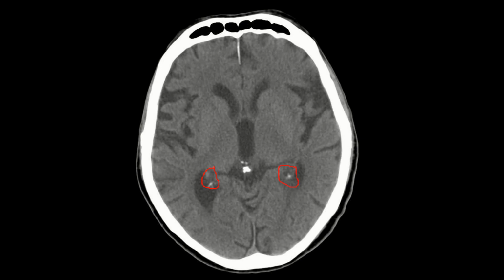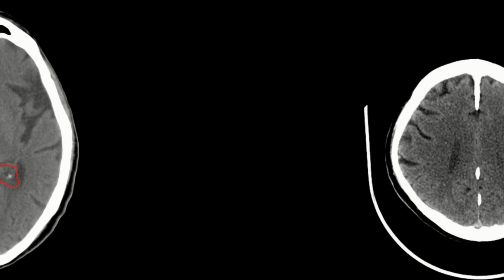And dead center, right behind the third ventricle, is this midline calcified structure. So this is the pineal gland. The pineal gland also does undergo calcification, and also, if you notice here, the falx appears kind of white. So the falx is another structure which undergoes calcification.